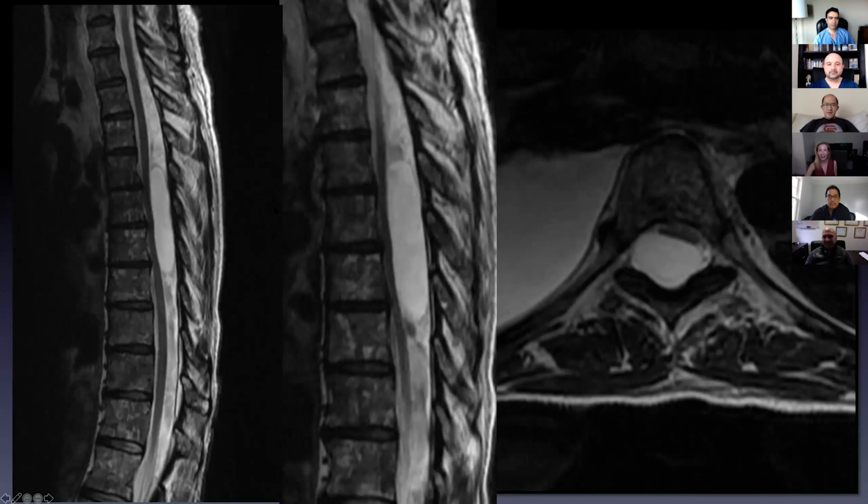Oh, Coy. Hey, Wendy. Yeah, so it looks like an arachnoid cyst. That would be my bet. You can't say what until you say why. Well, you see on the sagittal the rostral and caudal holes of the cyst wall. You see it's eccentric to one side. I'm not sure if that makes it more one versus the other. And maybe you can comment on the flow voids as well.